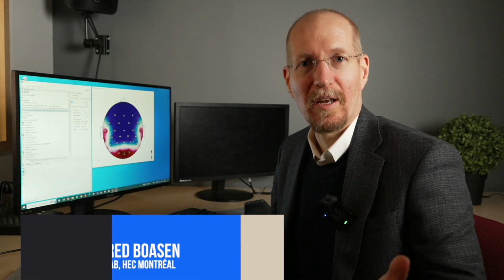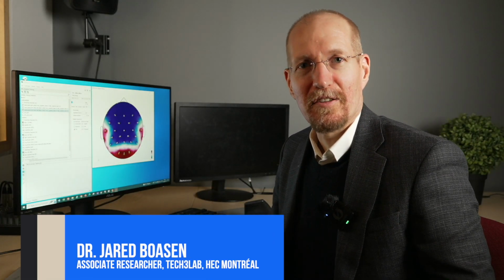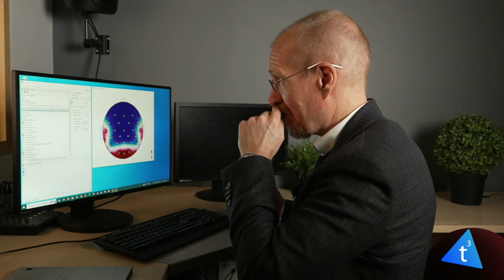In this final segment of the EEG analysis tutorial, I'd like to cover a few things that are not essential for the pipeline, but nevertheless they are important aspects of EEG analysis and things which you might be interested in learning. The first of which is how to actually get the p-values that we've calculated from doing our t-tests. So let me show you that very quickly.